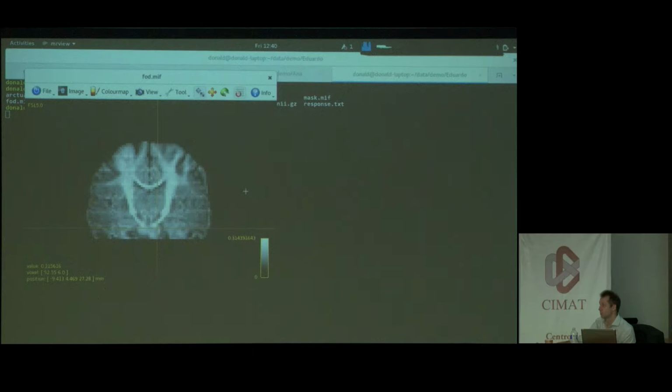I don't know why it's still there, but it's there. And that means that now your even slices will have a 2-second gap before anything's happened, but your odd slices will be coming right after the even slices have been played out. So because of crosstalk, the odd slices will have been saturated a little bit more than the even slices before they get excited. All right? So that's the cause of the problem mostly.